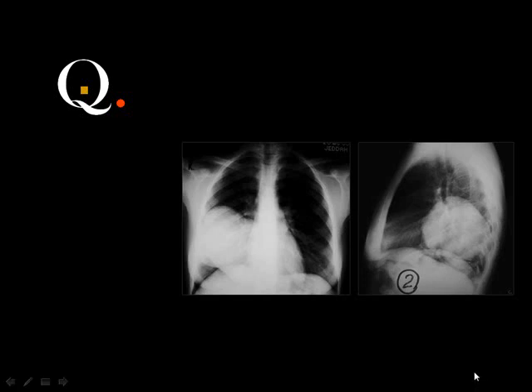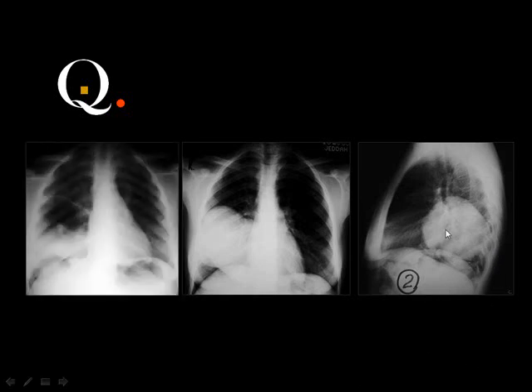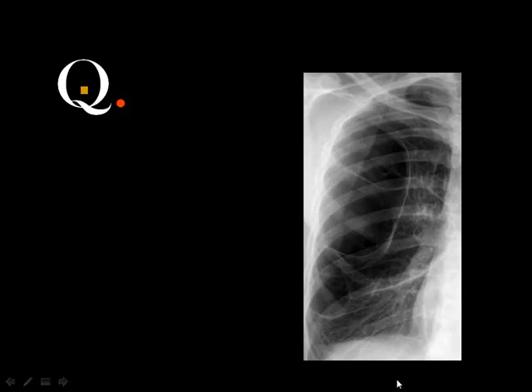Mass. Can you reach the diagnosis, or do you need further evaluation? Yes, you need CT to know if this mass contains water or not. If it contains water, it will represent a hydatid cyst. If not, it will be a bronchogenic carcinoma. This patient did not perform a CT, but performed a follow-up after 1 day. And this is the follow-up. Yes, ruptured hydatid cyst. This was a hydatid cyst and ruptured with a wavy air fluid level. Okay.